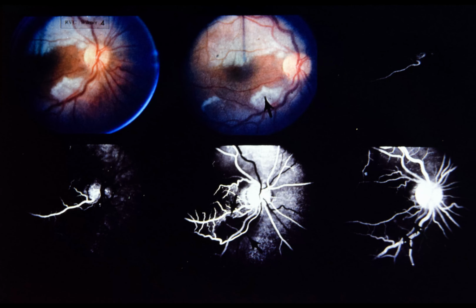Slide 4. Central retinal artery occlusion with cilio-retinal artery sparing. This 23-year-old white female has been followed at Hopkins since age 3 for recurrent episodes of fever, skin lesions, myalgias, arthralgias, and leukocytosis. A muscle biopsy at age 3 showed changes consistent with polyarteritis nodosa. She has been treated with systemic steroids intermittently for the past 20 years.